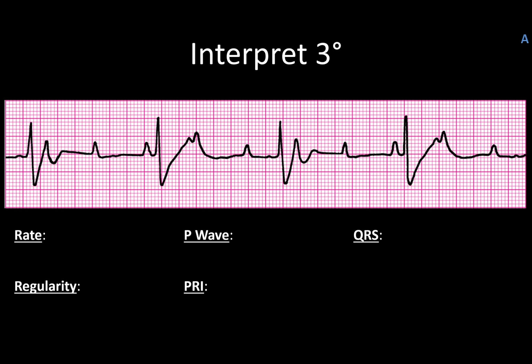It may feel like I'm really starting to overdo these at a certain point, but I want to make sure we have plenty of practice, because finding third degree heart block really uses every one of the skills that you learn along the way as part of basic and advanced arrhythmia. But I promise we're almost done.